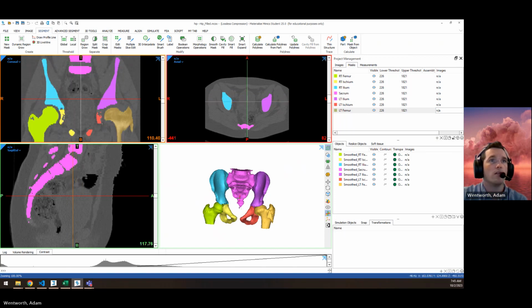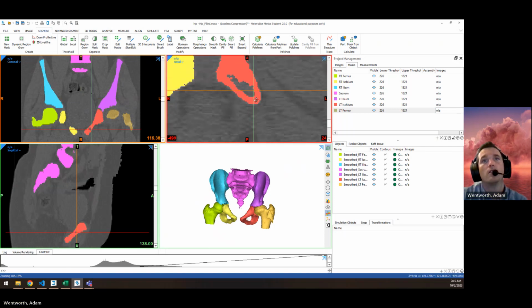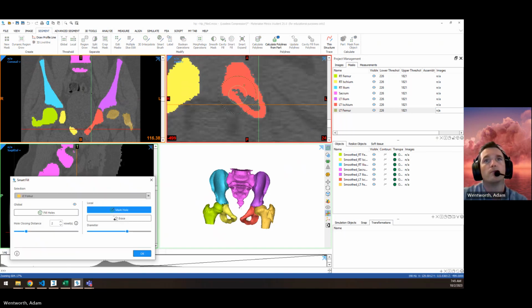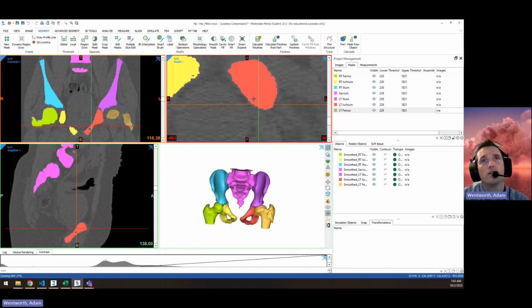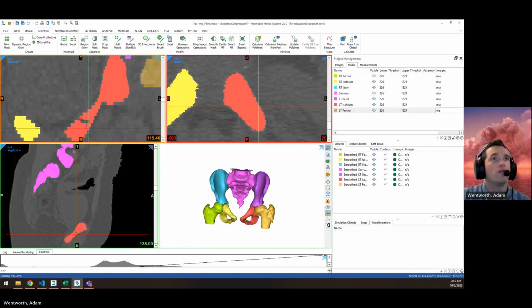So you notice here's the fracture line and that bone, and see there's some gaps, maybe in this part of the bone here. So you could fill it in. That's a left issue. But if we just take that into 3-matic, then that's easily filled. Even if we just do an auto fix on the bone, since it's porosity that's contained inside, we can also wrap with a very small amount.